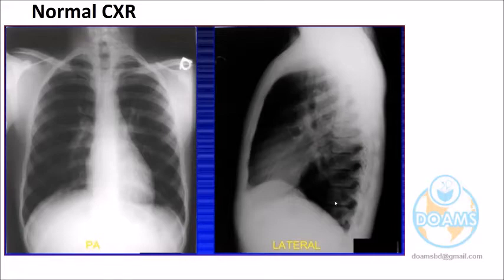Retrosternal space, retrocardiac space, this is normal looking. In general, if any growth is there, this black area will be smaller. Even then, the vertebral column is there, the thoracic part is shown. Some major or gross lesion will also be visible in the bony thorax, especially in the vertebrae. So don't think we are looking only at the viscera, but also at the bony cage.